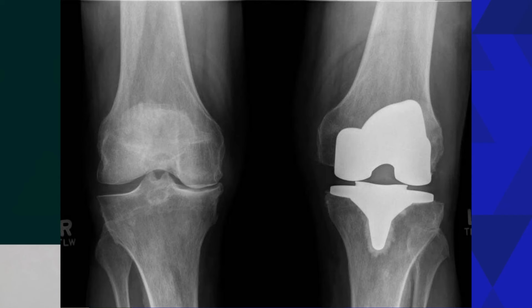Most of these components will have what's called a locking mechanism, which is basically the way that the plastic inserts onto the tibia. So in this component, instead of the tibial piece being completely flat on the top, that little part of a bright area, the metal on the top of the tibia, is the locking mechanism of that type of device. But you can see there's no more bone-on-bone contact. As opposed to the other patient's knee on the right side on that x-ray, where you can see bone-on-bone contact on the inside, and a bow-legged knee and a knee that's really worn out cartilage-wise on the inside.